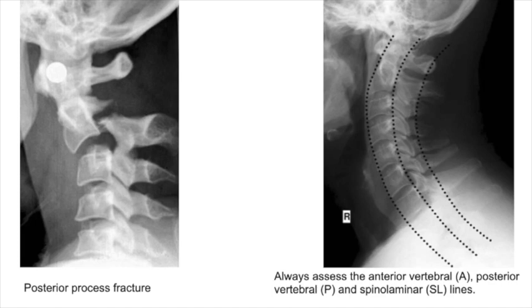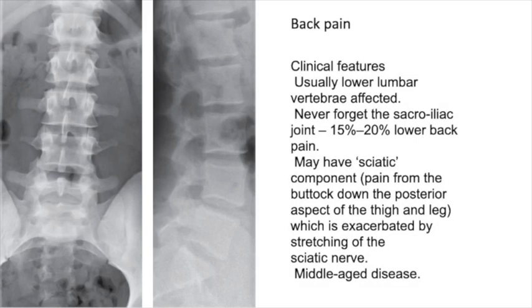It's very important for you to know that. You are never going to miss a fracture or any dislocation. Remember, this is the assessment of the cervical spine in the lateral cervical X-ray from C1 to T1. So now another important pathology is back pain.